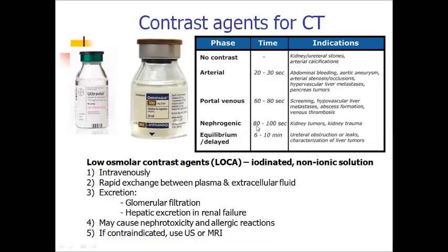Its duration is about 80 or 100 seconds and it is very helpful in searching for pathology of the urinary system. And the delayed phase, about 6 up to 10 minutes, where we observe excretion of contrast agents through ureters and bladder.